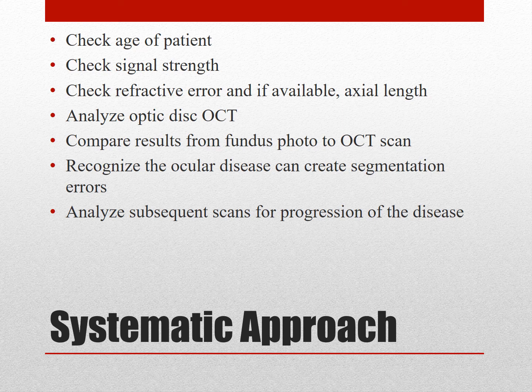You want to look at the nerve fiber thickness map, the deviation map. You have the neuroretinal rim thickness map, as well as the nerve fiber thickness plot there. And then you can look at the value chart. And then you have the quadrants graph and then the sector graph, just to break it down even to the clock hours. You have all that. Everything should correlate.